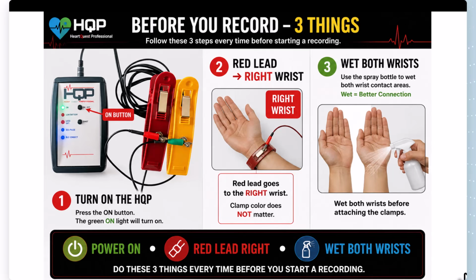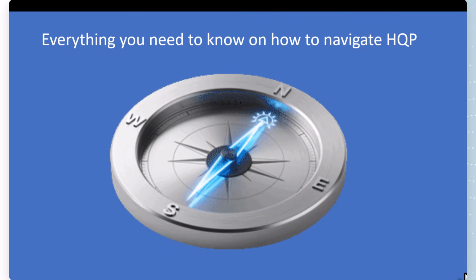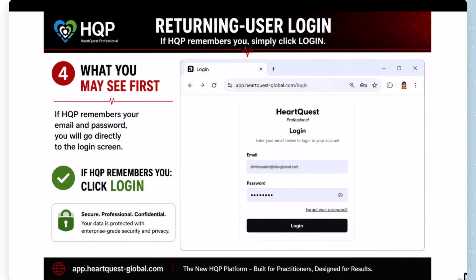Perfect. So here, everything you need to know on how to navigate the HQP is next, okay? And so here we go. So if you already are a user of the HeartQuest Professional and you've been using it for a while, all you have to do is log in. But if you're a new person, you're probably going to have to put in your email and come up with your password before you get in, and then you would log in.